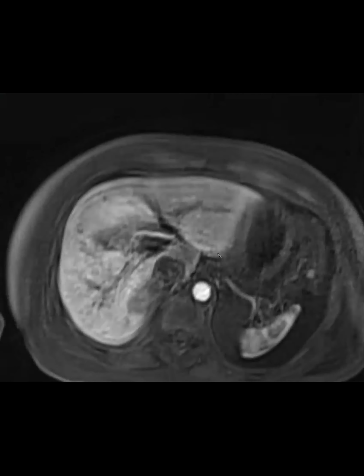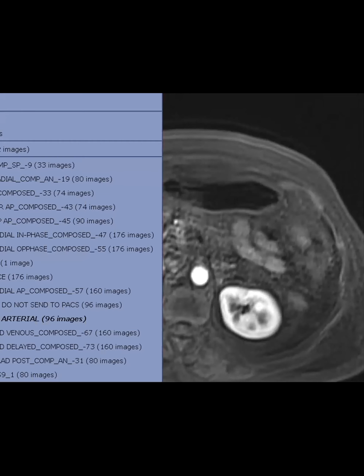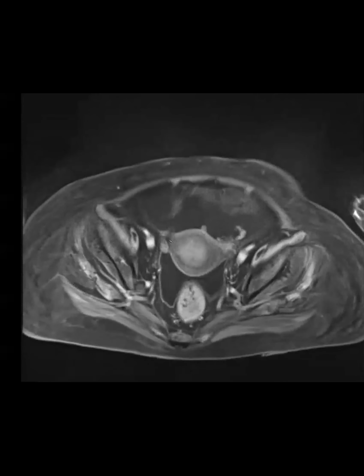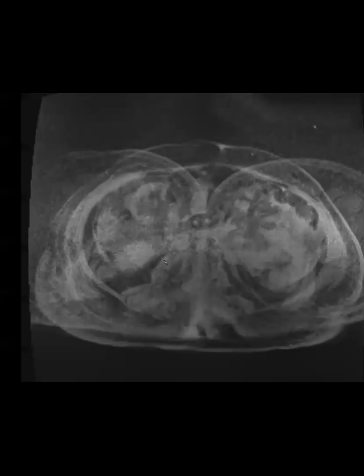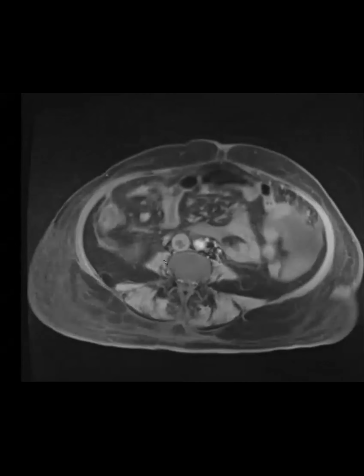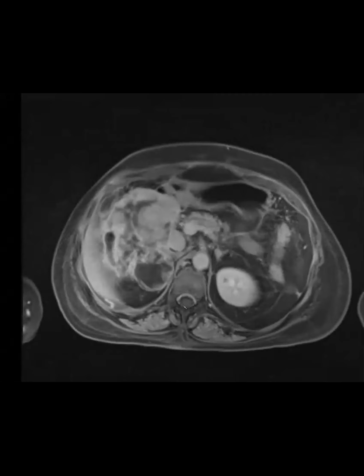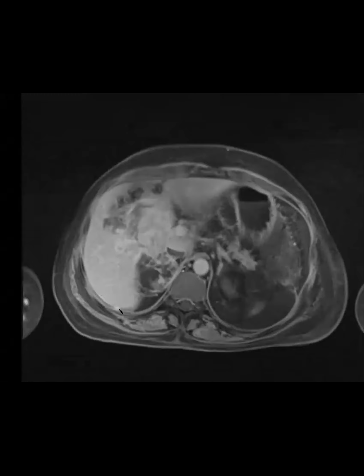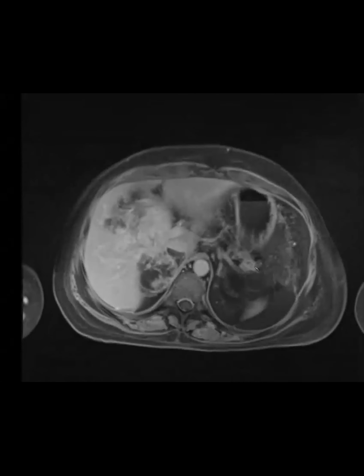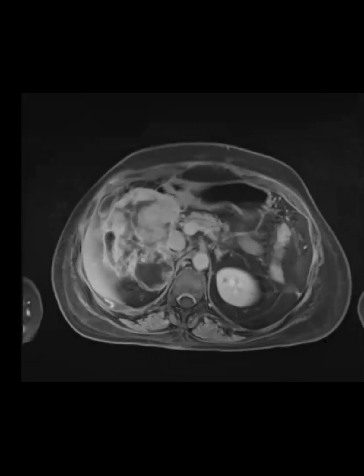On the arterial phase, there's lots of motion, but it has some enhancement. Like HCC, they can enhance and wash out. They also like to have central necrosis, so this is a very good look with this central necrosis for an ACC. And then we've got a lot of delayed enhancement and then enhancement in the IVC thrombus. So the question is, there is a nodule right here, and there's also this appearance of the omentum here. So what do you guys think?